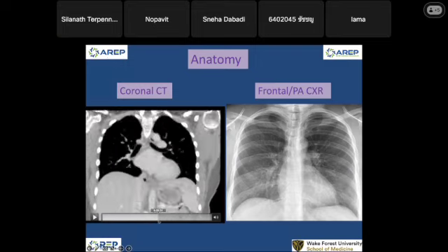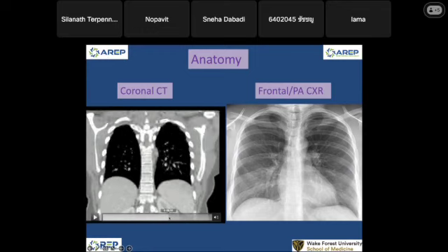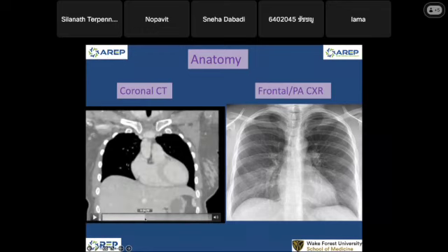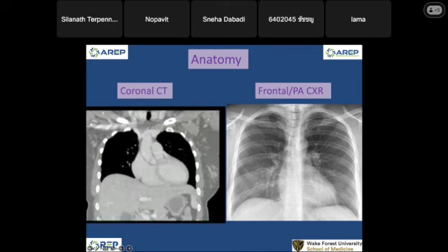And we also have a little bit of left kidney and right kidney. You can see it here. This is my right kidney and left kidney. And we can't see those structures on chest radiograph because they all blend together. And I think we see, let me look at this.